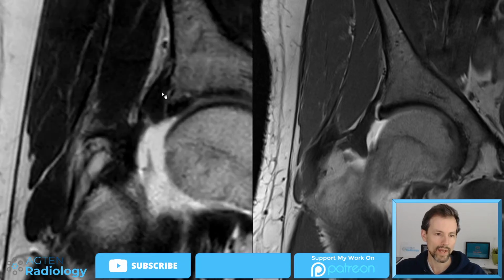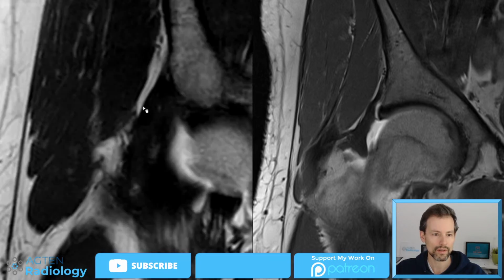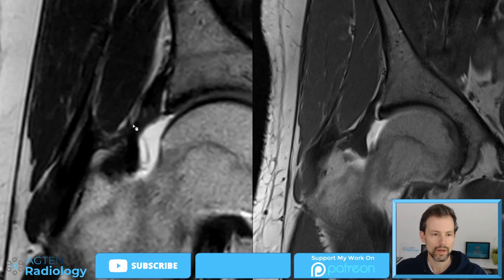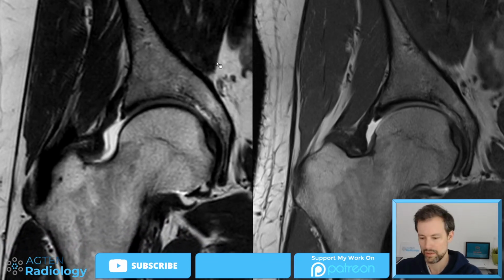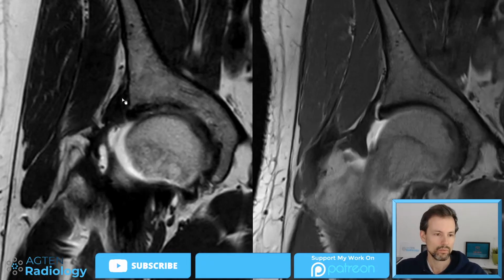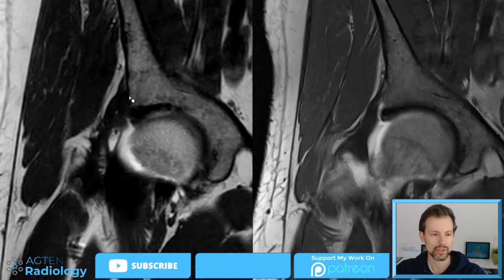So now let's move anteriorly, and we can start to see it's getting quite ugly here. So look at this. Let me just synchronize it so we have maybe less issue. So now they are synchronized. So moving anteriorly, and we can start to see there is a lot of hypointense, muscle-isointense tissue.